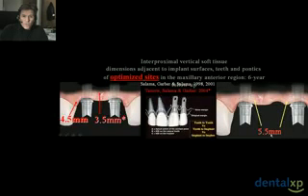Two implants next to one another, it can be as much as 3.5, really it's 3.4, and an implant next to a natural tooth, 4.5. Let's take a look at the final case before we break for question and answer.